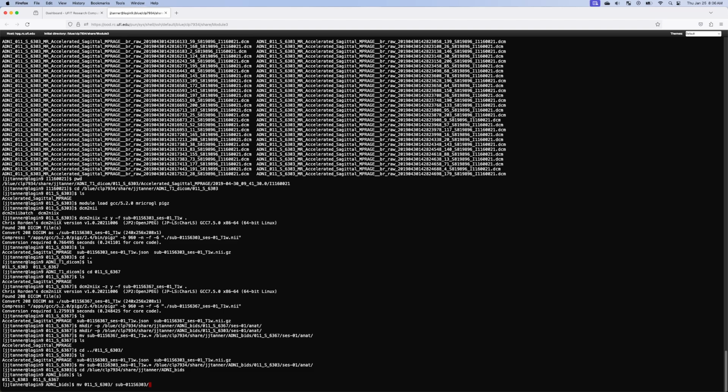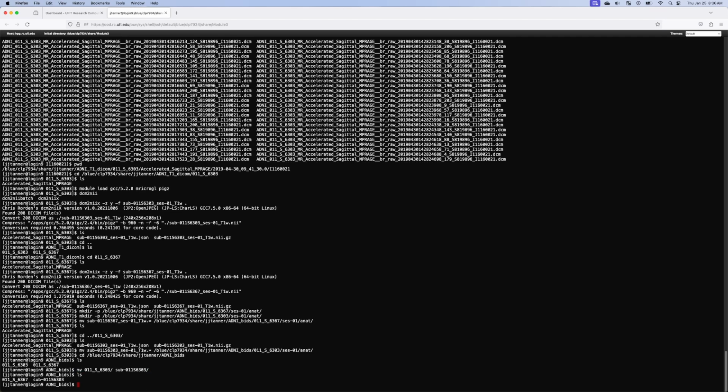Just like that. And if we look, now we have a 011S6367, and then we have one with a sub prefix. So we'll do the same thing for the other one. 6367, 6367.